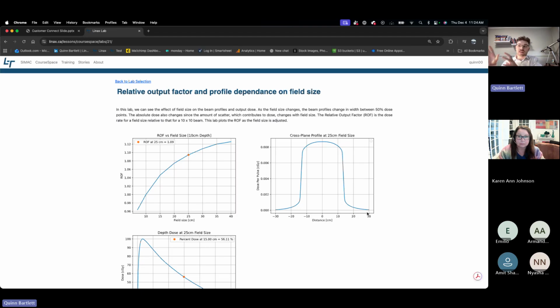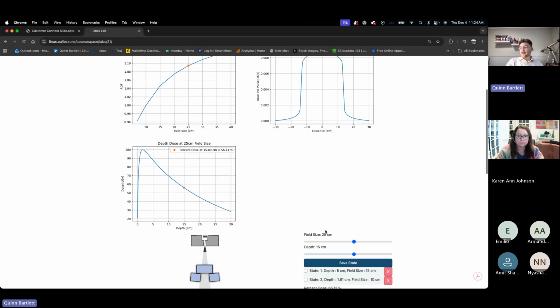Let's get an introduction to the lesson here, understand some theory. We'll play around with some parameters on the simulator, get some different results, but without getting thrown onto that full simulator and having to go through the full process.